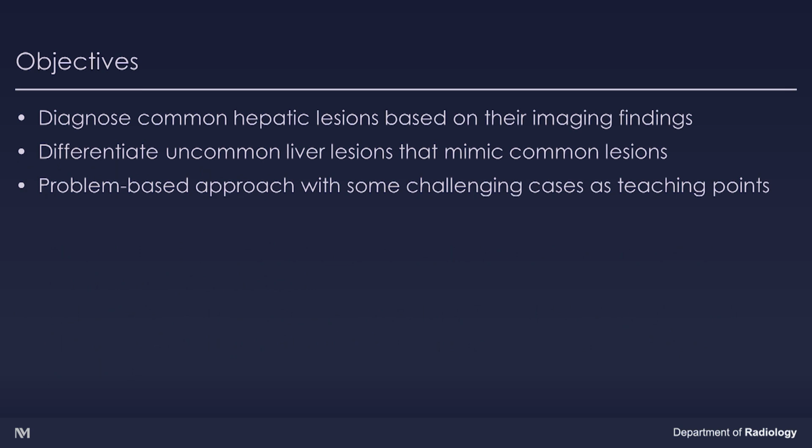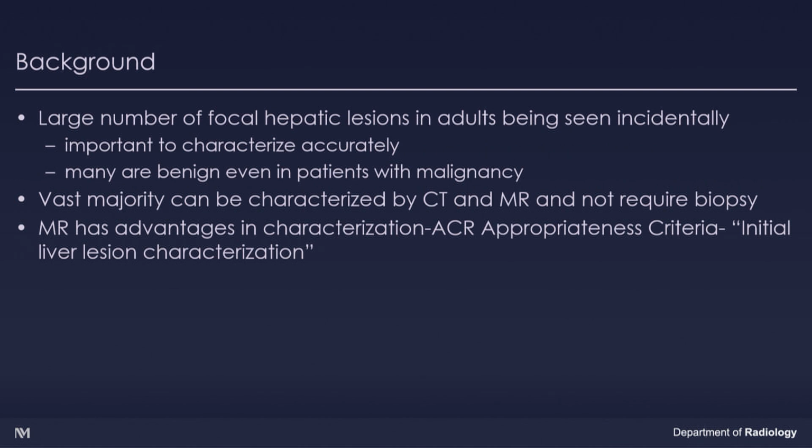So my objectives during this course are for you to be able to diagnose the common hepatic lesions based on their imaging findings. I want you to be able to differentiate the uncommon liver lesions that mimic common liver lesions, and I'm going to use a problem-based approach with some challenging cases as teaching points.